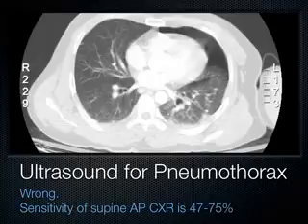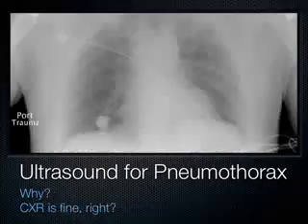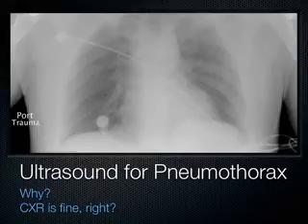Anterior. So if this person is laying down on their back, and they are by definition because this is a trauma film and you don't have trauma patients in c-collars sitting straight up and talking to you, they're on their back on a backboard. You take a film, and if that air has escaped from the lung and is sitting in a bubble anterior to their heart or anterior to their left lung, you're not going to see it. You can't see any line.